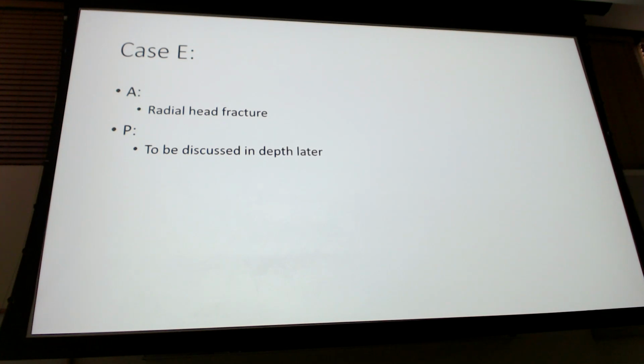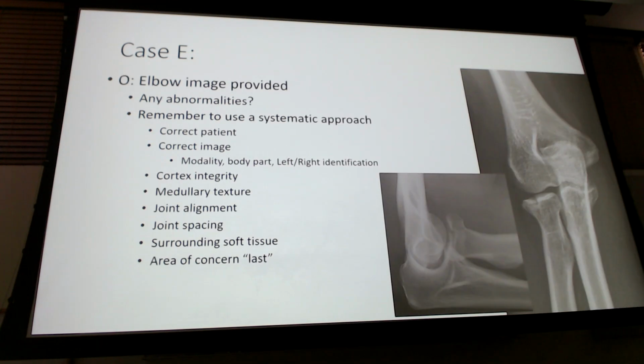Yeah? What about the ulnar head? Like, is it like a centroid or is it a bulging head maybe? Okay. So what he's looking at is this small little fleck of bone on the back of, it's not an ulnar head, this would be your olecranon process, right?